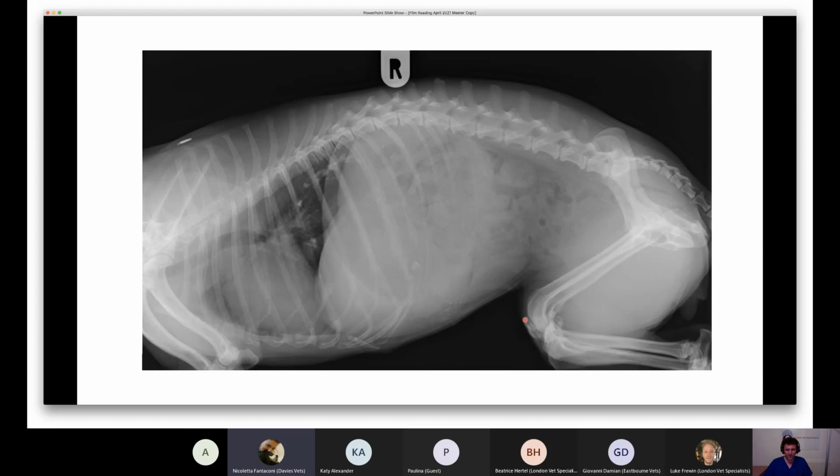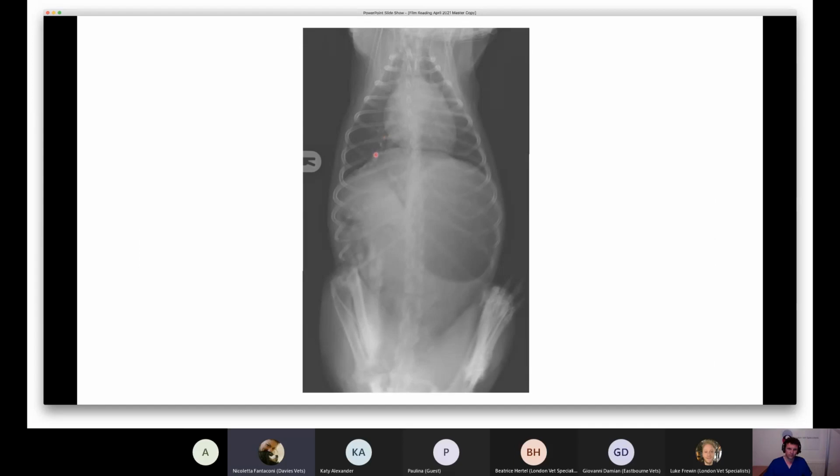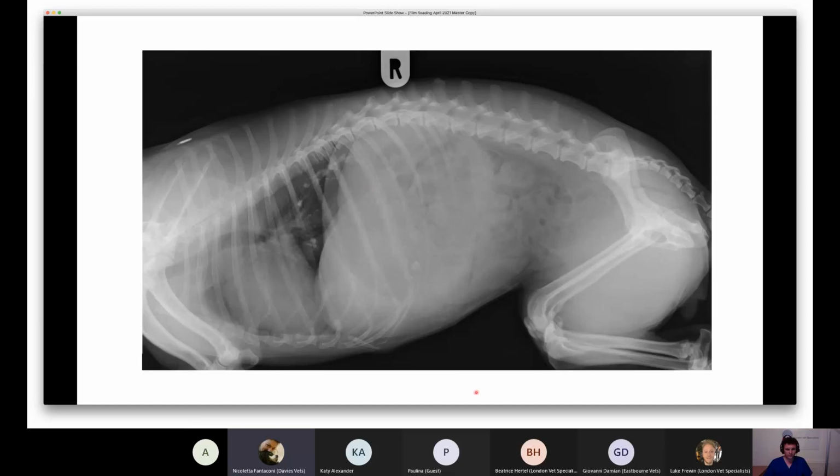To be honest, I would say, I don't know if I'm wrong, that in the thorax, the mineralized structure that we can see may probably be a mucus plug possible in the bronchi. I wouldn't put neoplastic metastasis in the differential diagnosis, because to me they don't look like it. I would put possibly mucus plug.